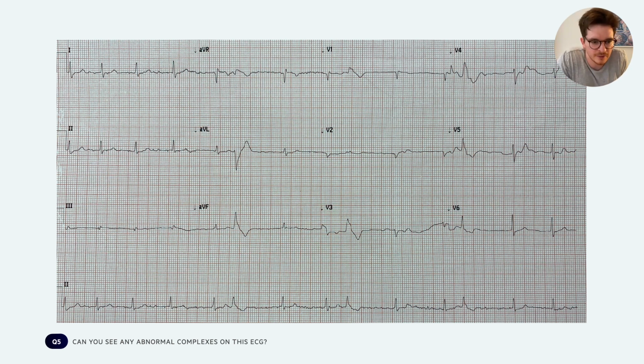So people are saying there are ventricular ectopics, which sounds promising, in AVL, AVF. And they can identify it because there's a widened QRS. Perfect. So this is showing some key things here. The background ECG is atrial fibrillation, but we're not going to be talking about that today. Here, the main thing is we can see there are these random extra beats that are occurring. They have a broad QRS complex.